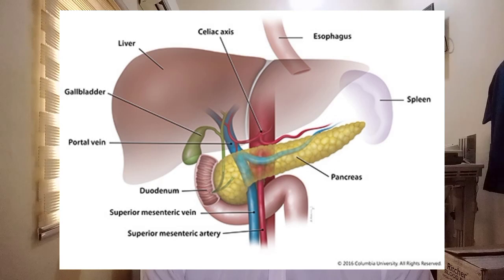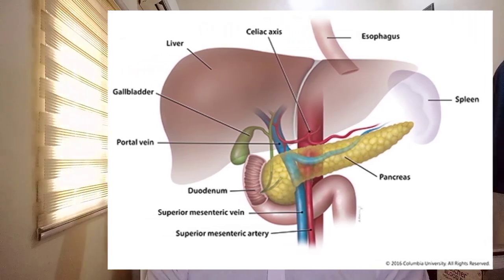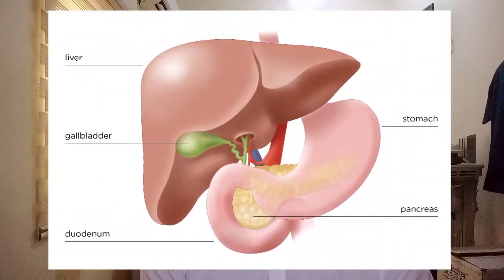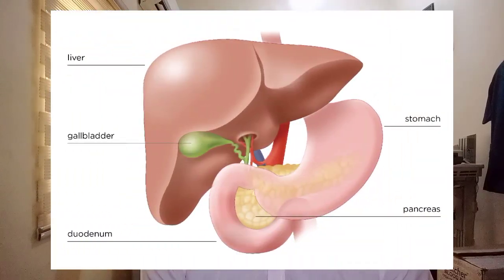The pancreas is draped transversely over the spine and great vessels. So it's draped transversely but anterior to the spine and the great vessels, which are the IVC and the aorta. The anterior surface of the pancreatic body borders the lesser sac, which is a potential peritoneal space. The stomach is just anterior to the lesser sac.